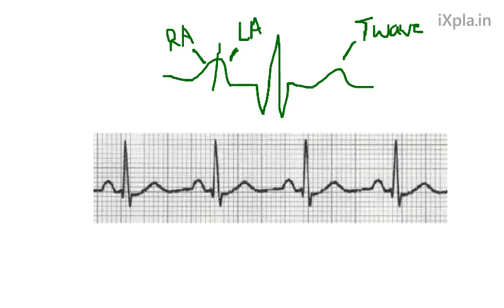Now these different parts of the QRS complex: this is called the Q wave. This is the R wave. And this is the S wave. The naming convention of the QRS gets a little confusing. The Q wave is the first deflection before an R wave, and it's always called the Q wave. So there might not be a Q wave, it might just be an R wave and an S wave. The R wave is the first upward deflection. Q is the first downward deflection.